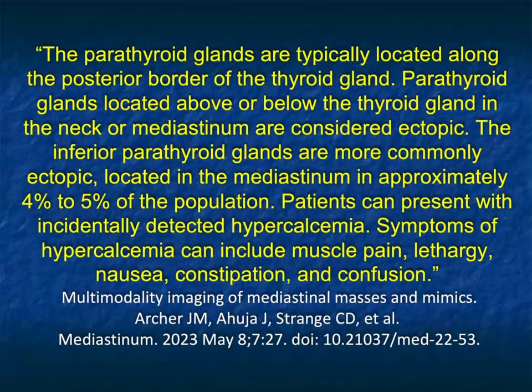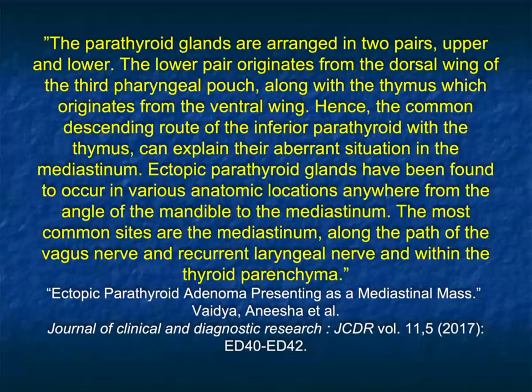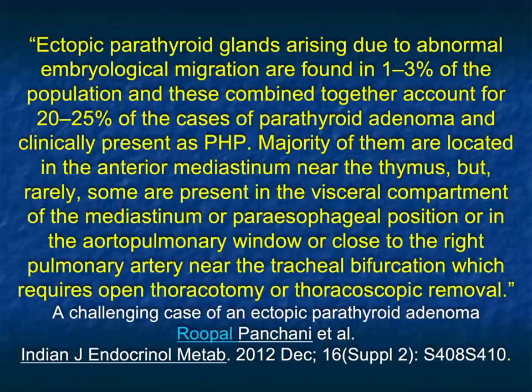It's often a very difficult and challenging diagnosis. And again, remember, you have to look very carefully. Thin section CT with contrast. Look along the mediastinum. Look along the path of the vagus nerve and recurrent laryngeal nerve. And look also carefully within the thyroid parenchyma. It's a very, very difficult diagnosis.